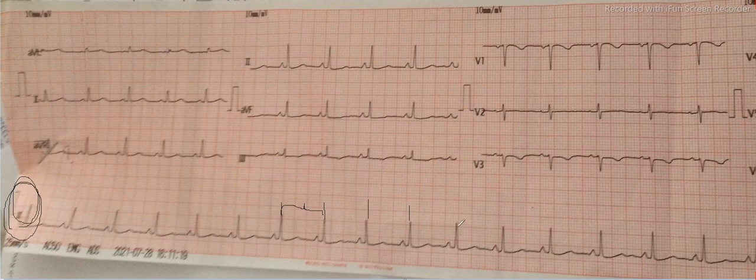Another example we can see here. So 1, 1, 2, 3. So pretty much 3.5. And here also you can take, it must be pretty much here, 1, 2, 3, and somehow 3.5. So it seems the rhythm here is pretty normal. So now to calculate the heart rate, what formula can you use?